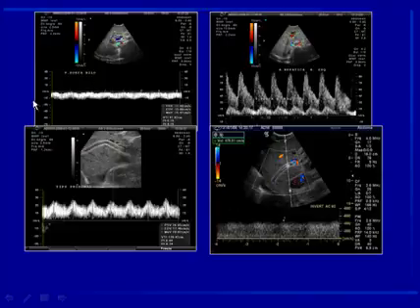This is one case of stenosis in TIPS, a low velocity in the main portal vein, the pathologic flow in the left branch of the main portal vein, a low velocity at the proximal third of the TIPS, close to 26 centimeters per second, and in the middle third we identified a velocity of 478 centimeters per second on Doppler ultrasound.